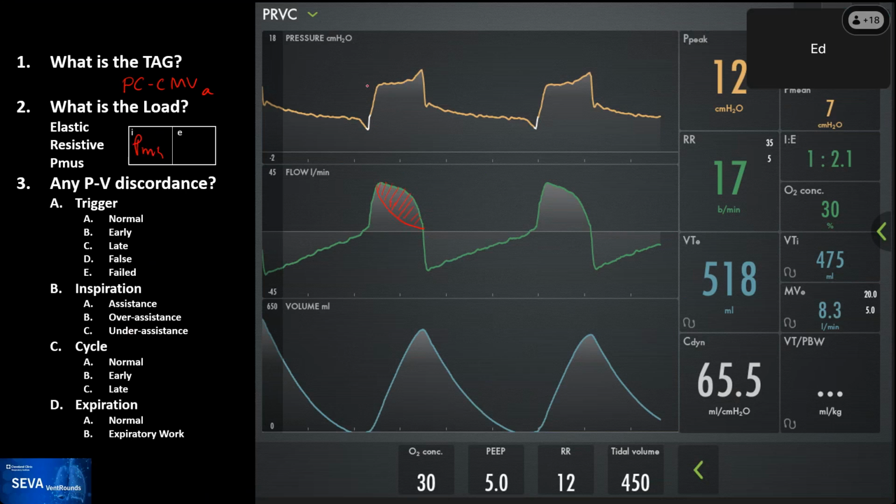And you can see that actually the ventilator is maintaining the pressure really well. And then at the end of this, the patient exhales or changes from inspiration rapidly. And you can see this beak, which essentially is a marker that the ventilator cannot pressurize or maintain the pressure because the muscles are moving to expiration. And then you see that beak there. We can talk a little more about that.